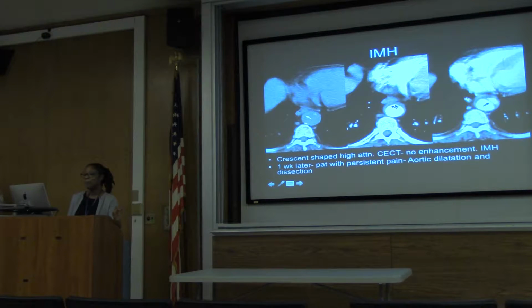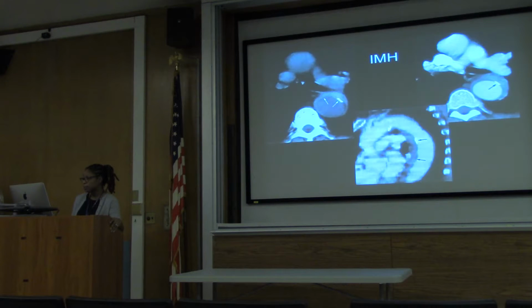I just want to make the point one last time. If we didn't do this pre-contrast study, you would just call this a thrombosed aortic aneurysm and you would completely miss this. This patient came in 1 week later, and you can see has developed a frank dissection in the aorta. So that's one possibility. They can regress or they can progress to dissection or even aneurysm.